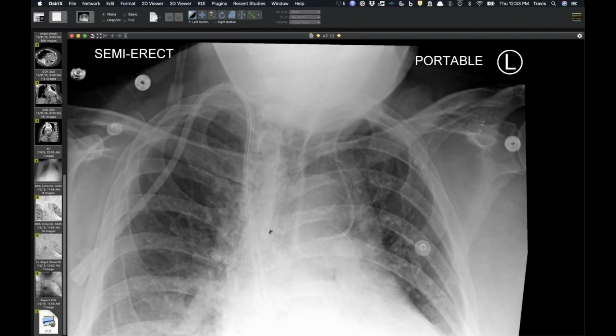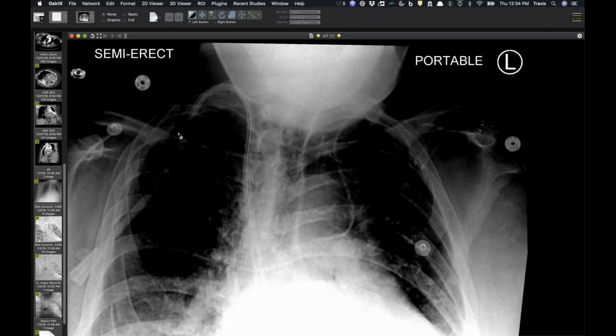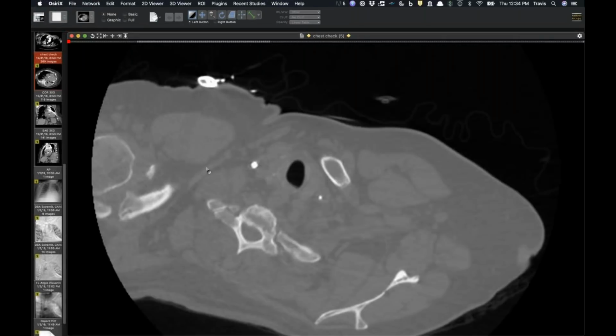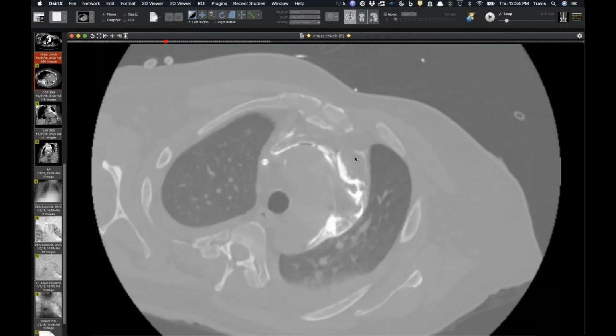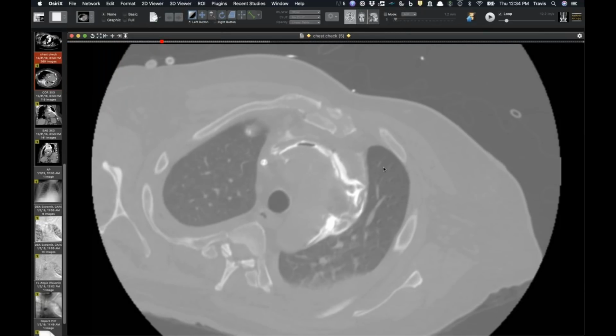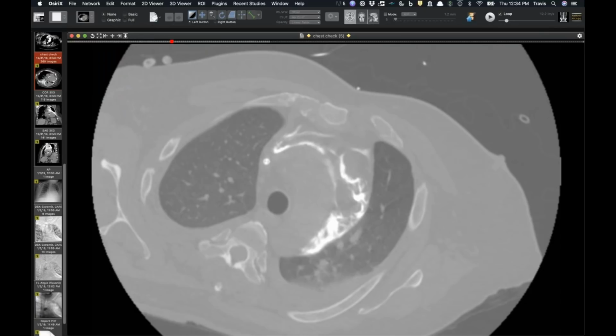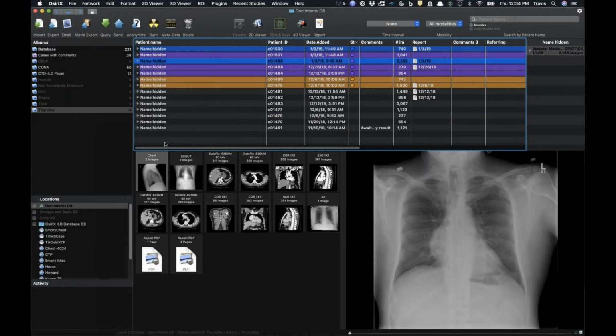So the tip of the catheter that we see on the radiograph is the most distal port that we're actually seeing the tip of. It's hard to know if it's just side holes for the other ports. I don't know how this thing is manufactured, but it's partly burrowed in the wall there. So okay. Wow. All right.